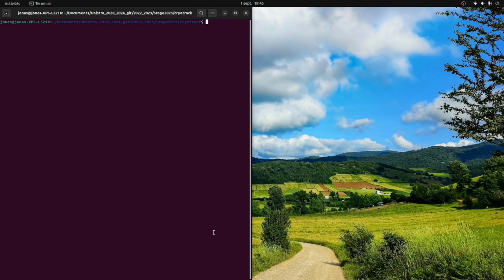First of all, before starting CryoTrack, we need to switch on the Trackstar, the EMT. Once this is done, we go into the root of our project, in which we have a driver for our EMT, which allows for communication between the EMT and Trackstar. The communication is done through IGT-Link. It is a protocol used for image-guided therapy.